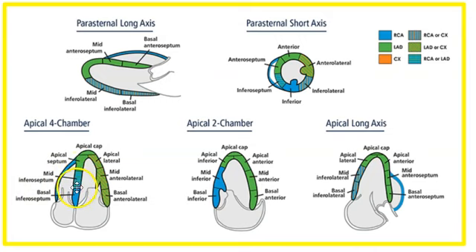Mid-inferior septum. Now this is important. What you have here, when we cut through the heart, now picture the heart, if we take our ultrasound slice out of the heart, we're actually slicing down through the septum. Septum's pretty thick between the two chambers. Our slice down through there, and when we flip it up and turn it into this four-chamber view, if we're looking at this and have our orientation correctly, we slice through there correctly, we're seeing the inferior septum of the heart as opposed to the anterior septum of the heart.